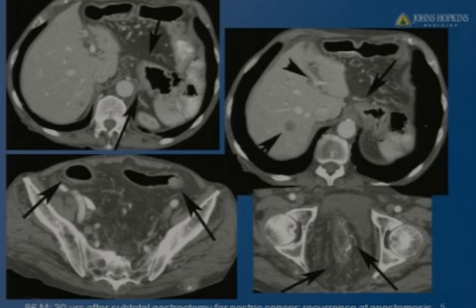And the lower two images on the left demonstrate featureless large bowel that is unrelated to his gastric cancer, or maybe related to stress-related factors. And there is increased fatty deposition about the colon with an enhancing nodule in the right lower quadrant. It shows his underlying long history of ulcerative colitis-related bowel changes.